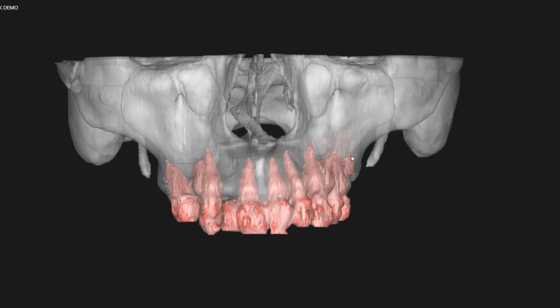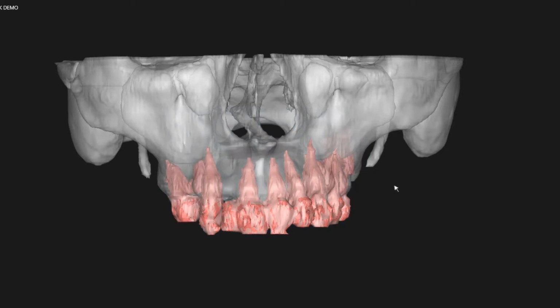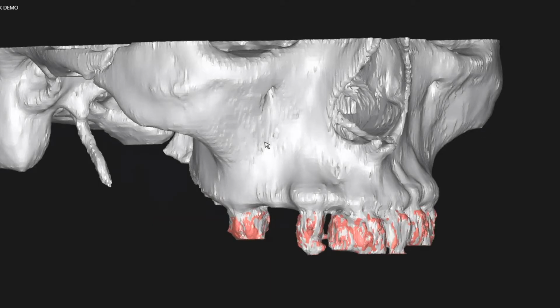And then anteriorly, would you just do a Lefort one? Anteriorly we're going to come up higher than a Lefort 1. We are going to come up to the lateral piriform aperture, which is the bony ring around the nose. If you go from anterior to posterior, just underneath on both sides, you see the infraorbital foramen. If you go below that about 1 centimeter, and you go straight down.